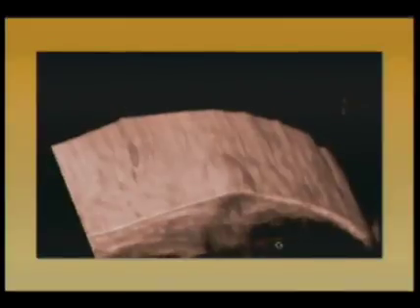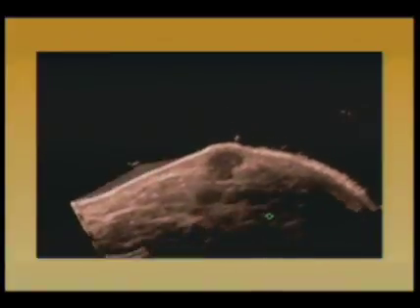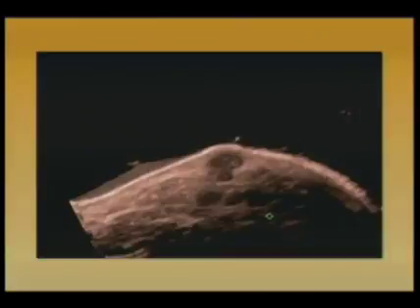And the same thing is true in the abdomen. Anything that contains or is surrounded by fluid, because there's such good contrast resolution between the fluid and the soft tissue that you're trying to image, you can get great 3D images. Now that fluid doesn't have to be endogenous. This is a case of a patient with neurofibromatosis whose arm was immersed in a water bath. And when I activate this animation, as I rotate it, you can see the part of the neurofibroma, the hypoechoic part that's underneath the skin, and you can see the actual deformation of the skin surface, the part that we actually see externally.